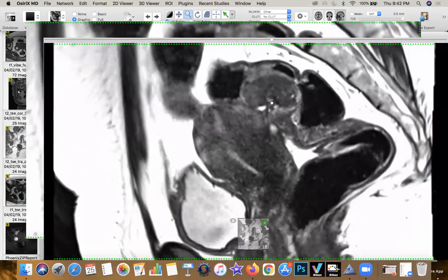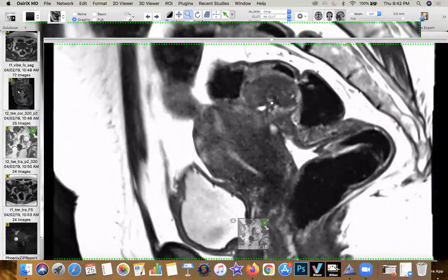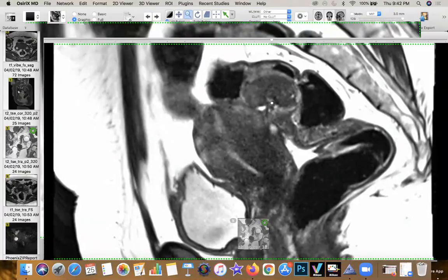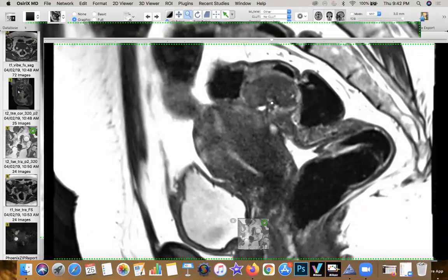As a radiologist, you need to identify three important structures here. A, is it only tethering the rectal wall? B, is it infiltrating the rectal wall but sparing the mucosa? Or third, is it infiltrating the full thickness of the muscularis and the mucosal lining and presenting as an endoluminal lesion? Now, based on these, the depth of infiltration, and of course, there are certain other criteria which are used, you need to identify and tell what's happening to the rectum itself. So here, there are 2 points which you need to remember. Of course, the depth of infiltration, that's surface, muscularis, mucosa. That's the first thing you've got to remember.